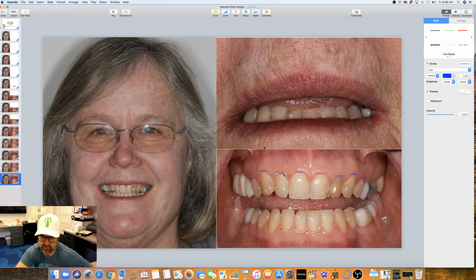Let's go ahead and do the mandibular gingiva, which oftentimes isn't as important to people because it doesn't show when they smile. But there are those people that lift up their lip or lower their lip and say, what is wrong with this gingiva? It also helps you determine if teeth are worn, if they've grown or compensatory erupted, if you need to address that.